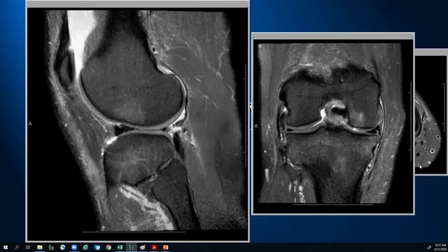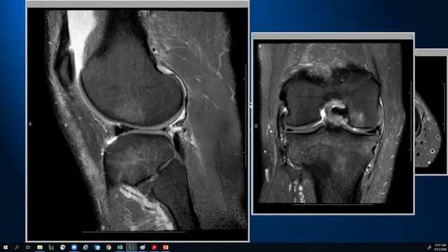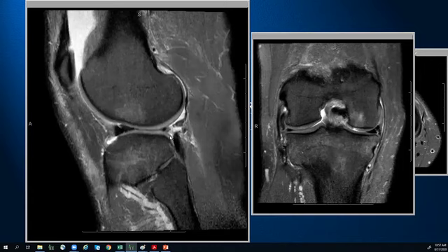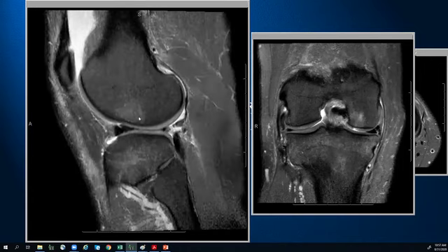And I'm panning around on a few slices. I'll see if I could find it on the axial somewhat. All right, great. So we're seeing multiple responses for flipped meniscus. So that's accurate. So basically, we're missing our posterior horn or posterior root attachment of the lateral meniscus that is flipped forward and is inverted. This is the imposter. This is the native anterior horn.